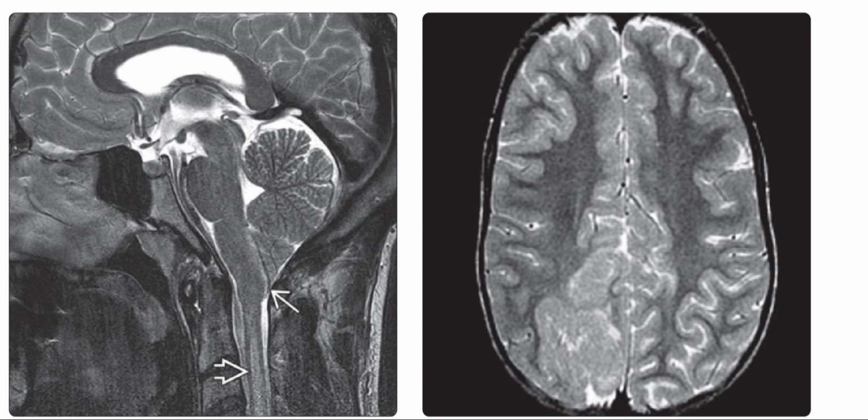In the right image, we can see that that's the axial sequence of T2 weighted MRI, and it's the same case, and it shows the mass-like thickening of the right medial parietal gray matter and distorted sulcal gyral pattern of cortical dysplasia.